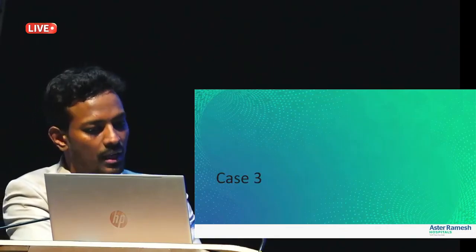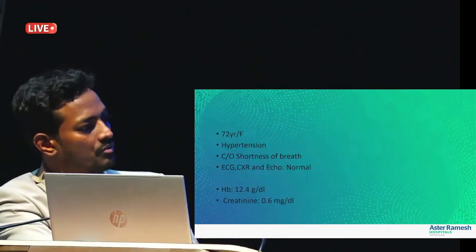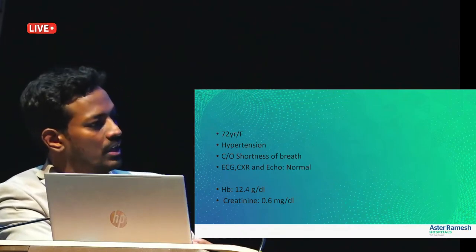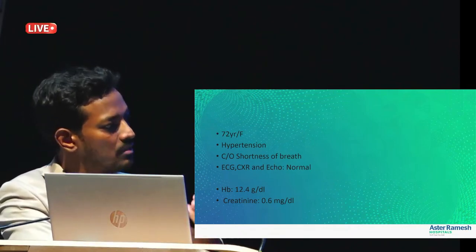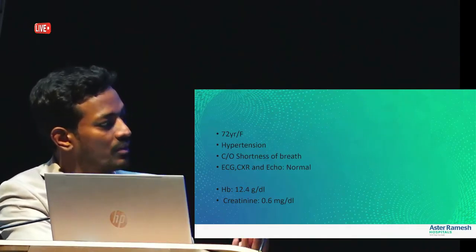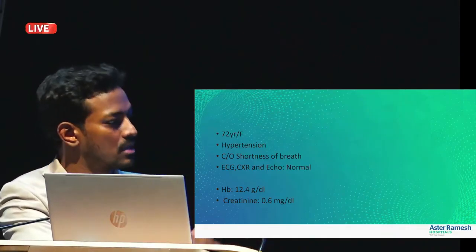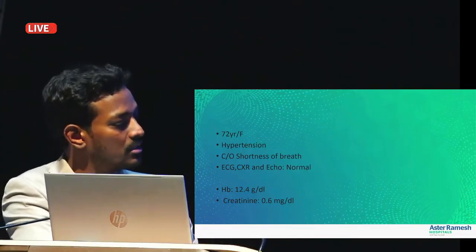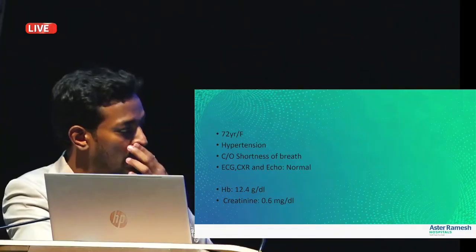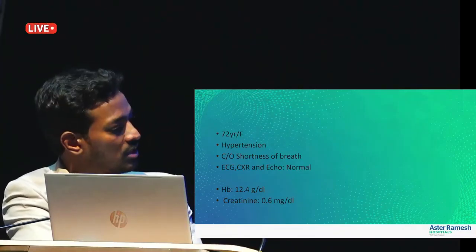So, a similar case, the third case. Again we wanted to show cases where initially we validated, and now we have all the information with the CT itself, and our invasive assessment was almost similar to what we are seeing on CT, and this is helping us a lot. Even before taking the patient to the cath lab, we know all the information: how the lesion is, what the plaque characteristics are, and what the physiology is.